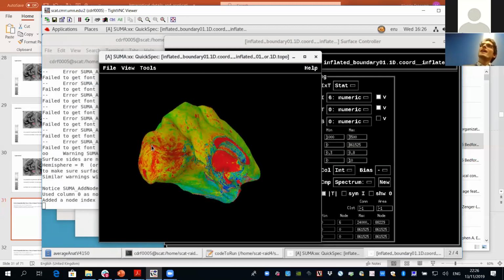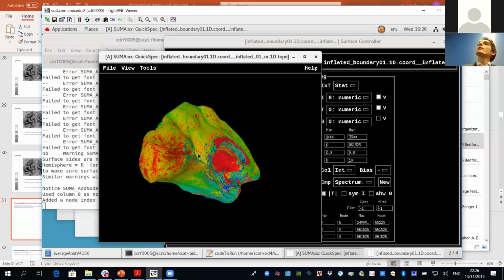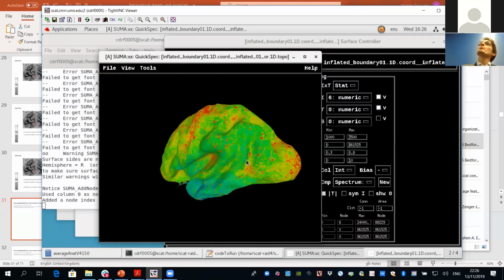And there is less of a curvature leakage here, so there is less of a stripy pattern than we showed before. This is because here the data is generated from a 0.5 millimeter isotropic acquisition, and we have multiple anatomies averaged together, and so you get a better result that is more smoothed.